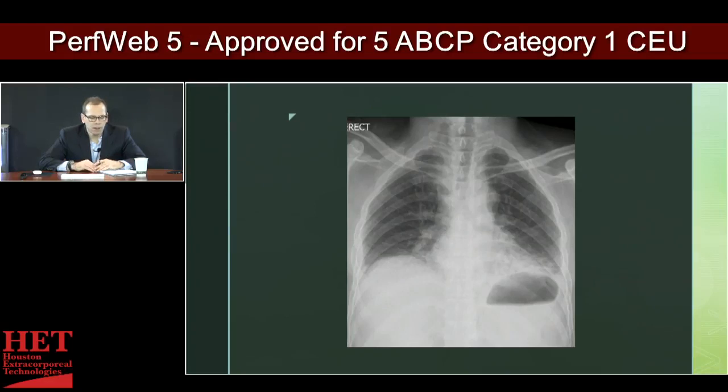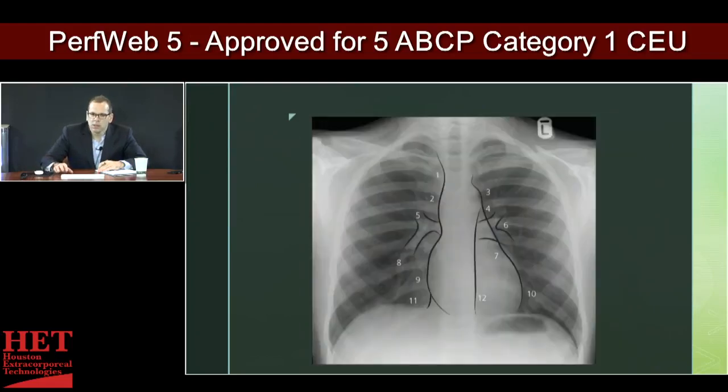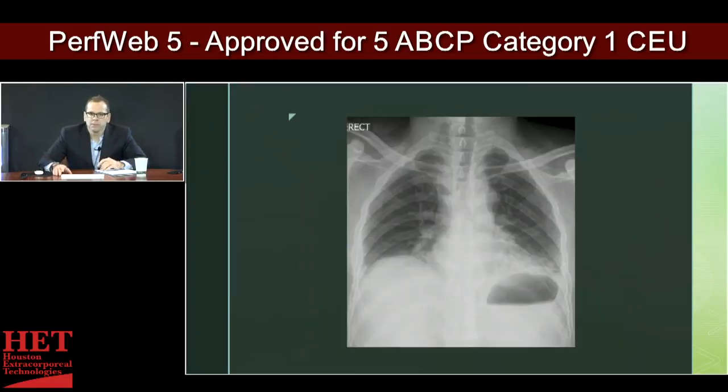So the second thing I look at is the bony structures. I look at the clavicles, I look at the ribs, I look at the trachea and the spinous process to see if it's aligned. If you look at this chest x-ray here, you can see that the trachea, which is here, we'll go over later, is fairly lined up with the spinous processes, which are right in the middle of each of the vertebrae. And so that lets you know that the patient is fairly flat.